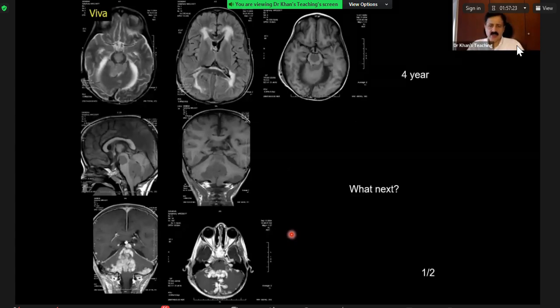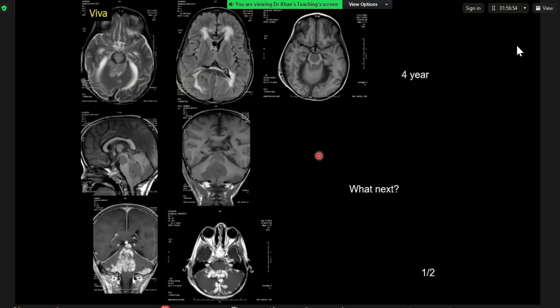Okay, candidate 3. Now, this case came on a CT scan. The patient presented with some kind of tumor. They passed a shunt, so the hydrocephalus has reduced. So this is post-contrast, pre-T1, FLAIR, and T2. So over to you. Okay, I'm presented with an MRI, and this patient is 4 years old. Thank you. I'm presented with a paediatric brain MRI of a 4-year-old patient who has been decompressed.